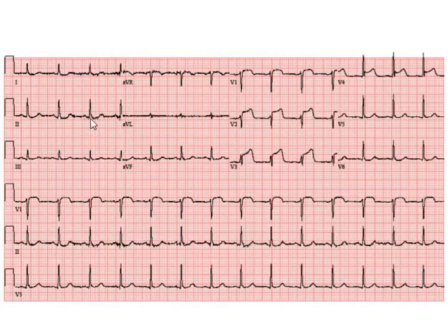The QRS axis is positive in lead 1 and positive in lead AVF, so the axis is leftward and inferior, which is normal. Because the QRS complex is narrow and sharp, there is no evidence of any intraventricular conduction delay. There are also no criteria for either left or right ventricular hypertrophy.